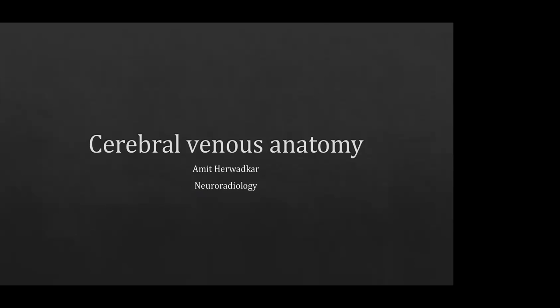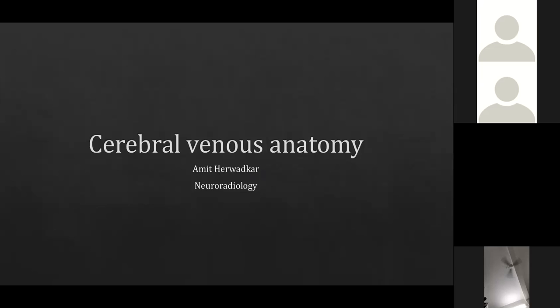And somewhere the understanding of venous anatomy and the venous pathophysiology behind the disease has lagged a little bit behind, but it is catching up. Certainly in the last 25, 30 years, the understanding of venous hemodynamics and the anatomy of the veins has substantially improved, especially with additional imaging techniques that are now available to us. So over the next hour and a bit, we will look at the anatomy of the venous system, and as before, we will look at a bit of embryology, and then mainly anatomical examples with some pathology to highlight the anatomy behind it. So let's begin, friends.